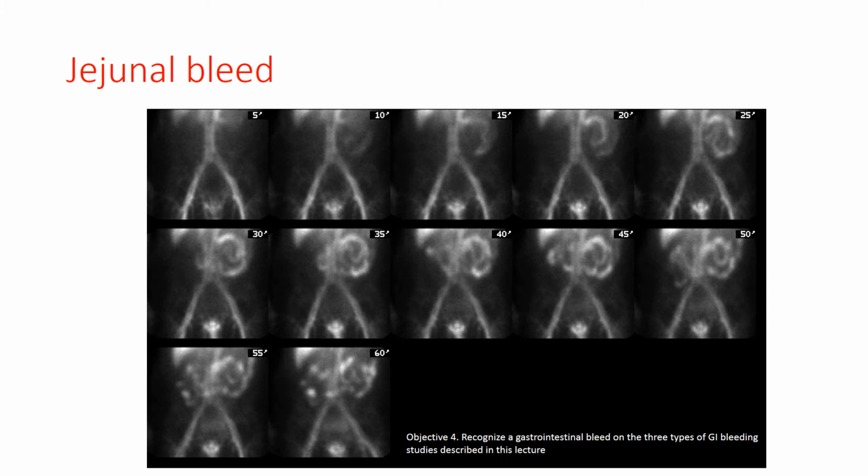Now, this is an abnormal bleeding study. Again, we see blood in some of the normal spaces that we would expect to see red blood cells in: the aorta, the iliac arteries. We see a little bit of the liver, maybe a little bit of spleen. I'm not sure we really see much spleen. It kind of seems to be peeking out behind this 30-minute mark. We do see, again, the penis. This is not a rectal bleed.